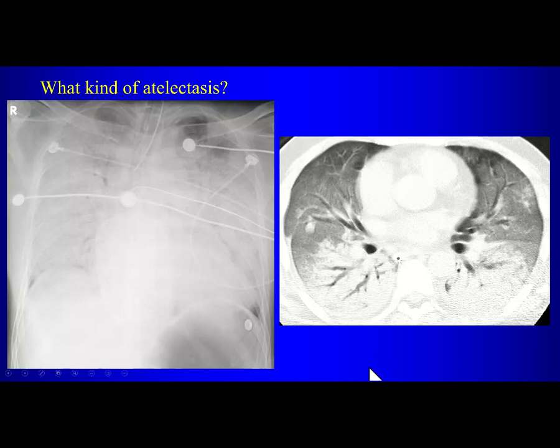So normal or abnormal? Abnormal. Abnormal, what's wrong? Looks like there is. Well, first describe the abnormality. What's the abnormality? So it looks like there's gradient. Well, before we get to that, tell me what the abnormality is. There's opacification of both hemithoraces. What do you think those opacities are, mass, effusions, what are you going to call them? Atelectasis. But before we get to that, okay, what are you going to call those opacities on the CT and the chest radiograph? We're going to call them what?